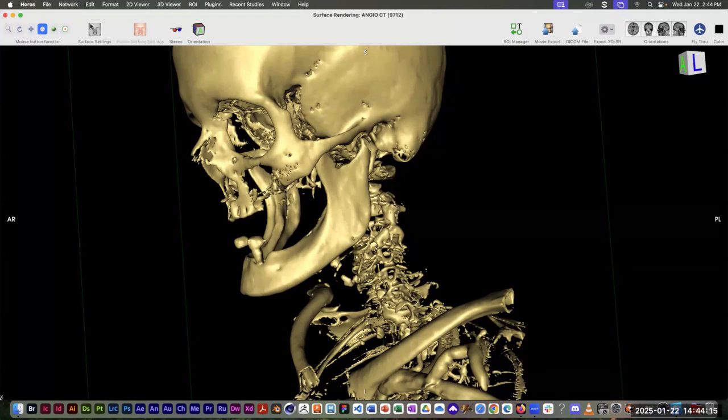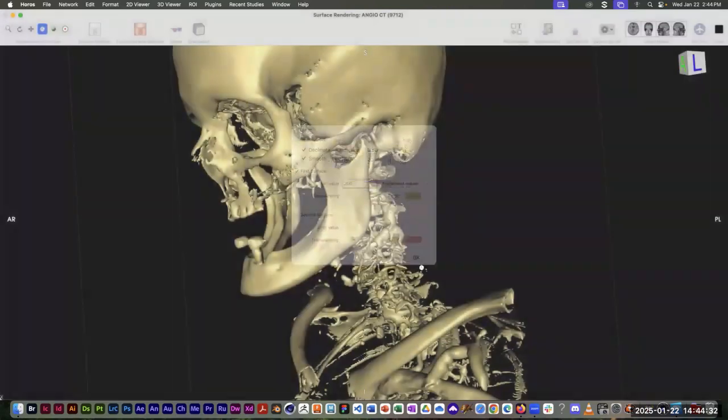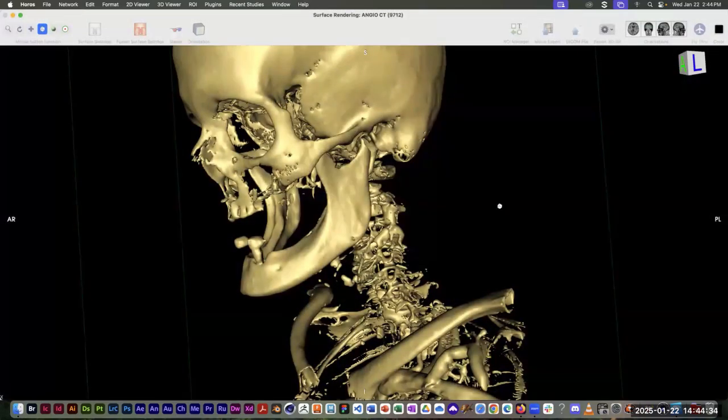You can go back in here and now start playing around with that numerical value, but I'll be honest, I've had a heck of a time trying to get it to really do much of anything. Like I just changed from 500 to 200. Let's see if that improves things at all. You'd think it would be straightforward, but it's definitely not.